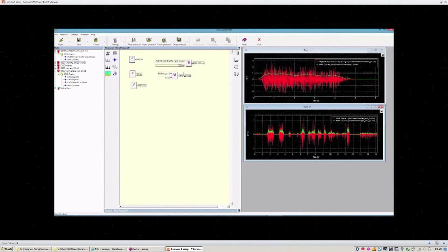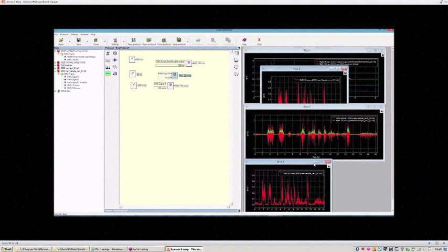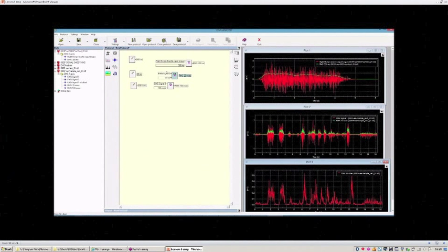and I want to apply the same root mean square with mobile window algorithm and show you the differences between the two. Again, the input, the raw signal, and the second, the time window. So now we can compare the two. First and the second. So as you can see, the smoothing effect is higher because we had increased the time window.